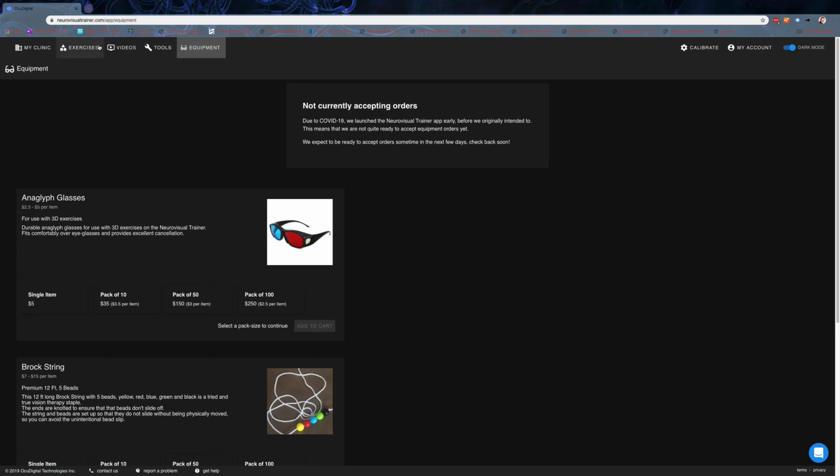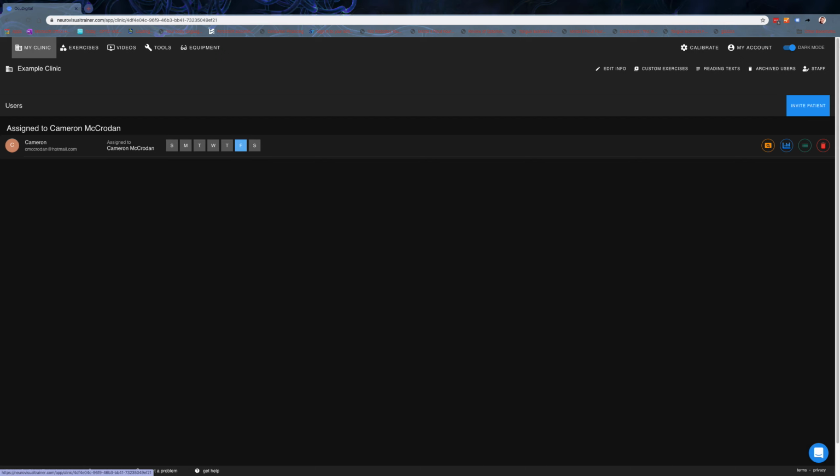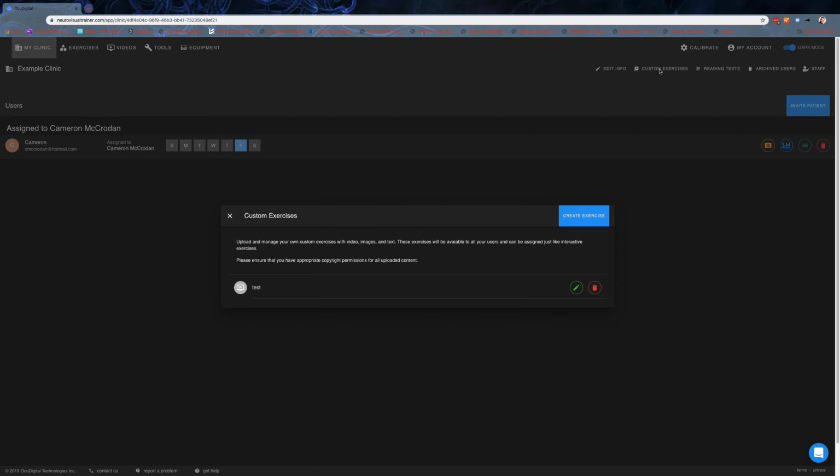So the next piece is, now that we've seen the exercises and videos, one of my favorite things about getting to use this program is the ability to upload custom exercises. So back in the main screen, the custom exercises area up at the top right, you can click on, you can see, so I had uploaded that test exercise.